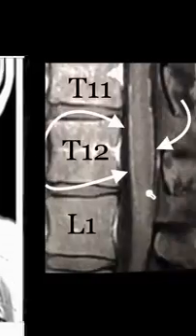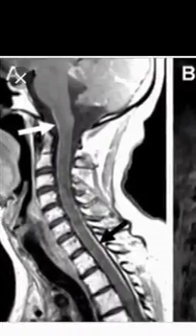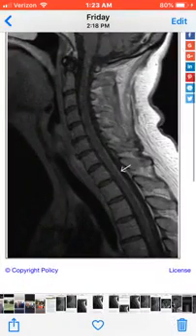So that is the difference here. Is it leptomeningeal metastasis or normal? And why is this normal and this is not normal? Now posteriorly we see florid enhancement back here, but still they're pointing to an anterior spot as well. That was also from Radiopaedia. Shout out to y'all. So that's the question.